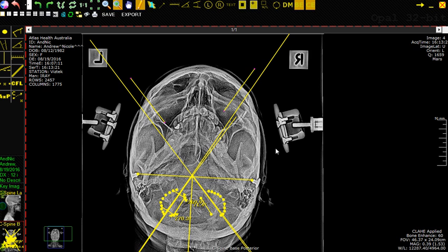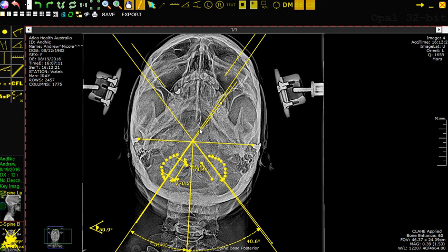And again, this corresponds with what we saw before when we actually measured these convergence angles. Well, this makes sense. This one was 31 degrees, so it's shallower. This one is almost 41 degrees, so it would make sense that in order to see that structure, we need to have an entry point for our x-ray at a different point and a different feature of the patient's skull.